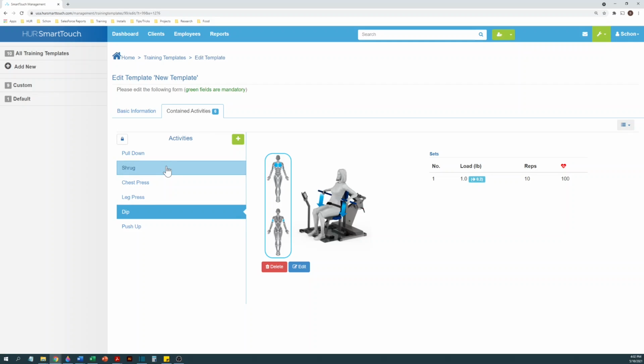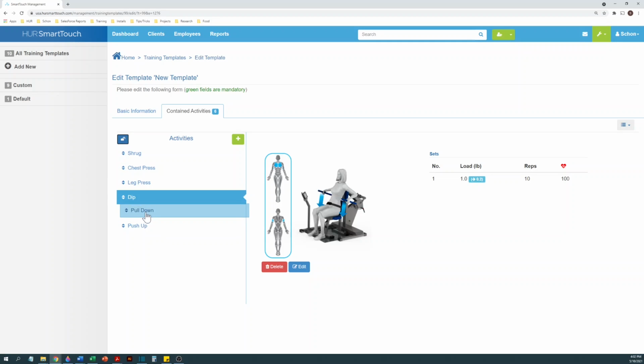The order of the machines here only affects how they appear here and on each of the machine's tablet displays. If you find it easier to organize them in a different way, you can select the lock symbol to unlock them and change their position by clicking and dragging them into a different position. To lock them back into place, simply select the lock symbol again.